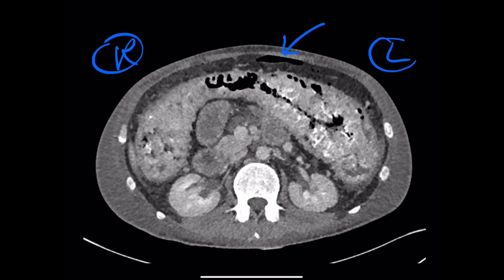That's black, that's air. That is not in the colon. Absolutely. So that's bad. That shouldn't be there. That's a perforation. Okay. So that's an indication that this patient needs really urgent treatment. So we're looking at a surgical abdomen that needs treating. Okay, fantastic.